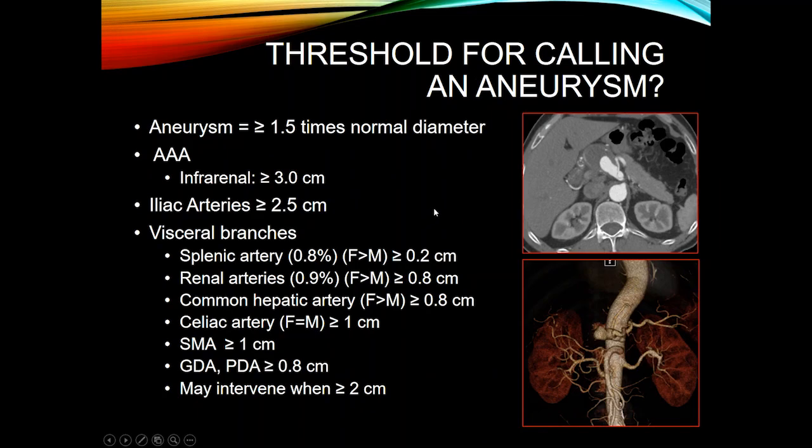You want to really consider what the threshold is for calling an aneurysm. If you're not sure, either way, it's very important just to report the diameter, and you want to again use double oblique imaging to get a true luminal diameter and not rely upon axial imaging for this. So you really want to be at the cross section of the vessel to better measure the aneurysms or the vascular caliber. And so these are just some concepts of how aneurysms are defined.